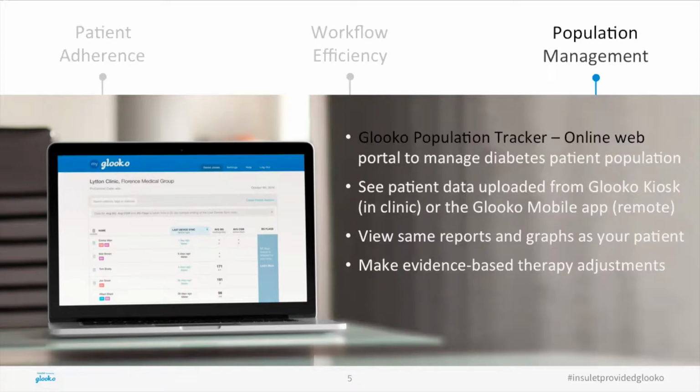The graphs and reports in Glooko are user-friendly and accessible to patients and providers alike. All reports visible to the provider are available to the patient as well. Reports include BG graphs and statistics, daily overview, daily trends, daily overlay, device settings, set and site change, temporary basal decrease, and others.